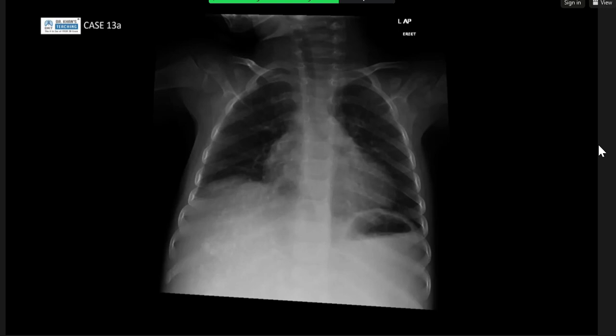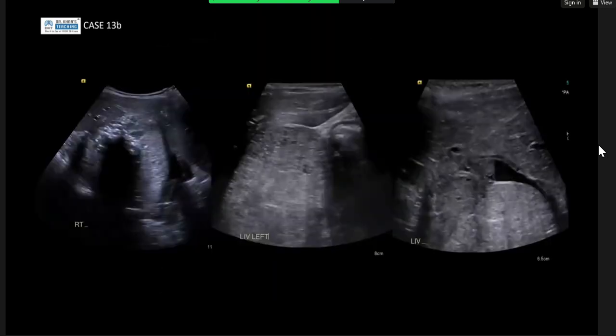So I would like to do cross-sectional imaging for further evaluation. Okay, before that, an ultrasound was done instead, and then I'll give you cross-sectional imaging after. The serial axial sections of the ultrasound show evidence of a heteroechoic lesion with calcifications and posterior acoustic shadowing on the right side, posterior to the liver. I think in the last image, the lesion is showing extension into a vessel.